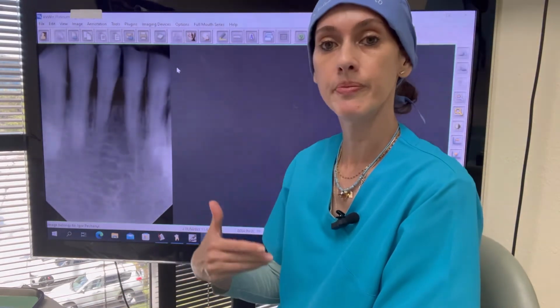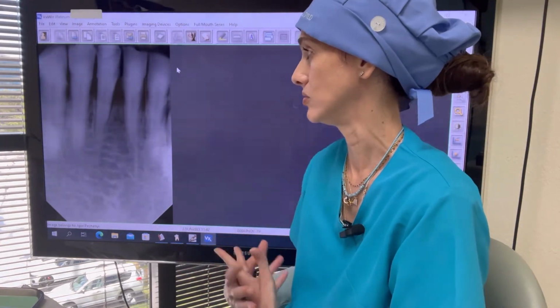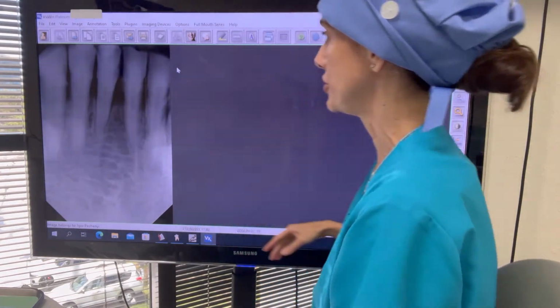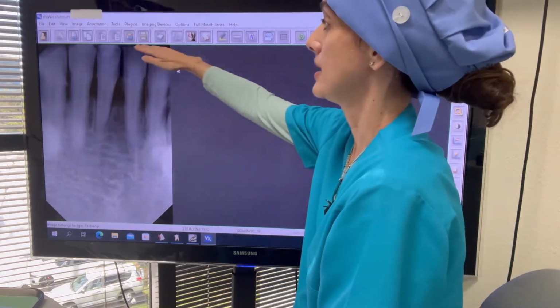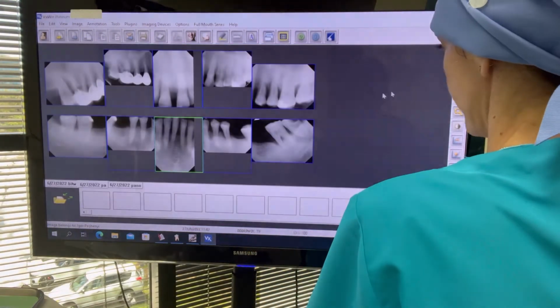Put the patient on a 3-month maintenance regimen of cleanings, good oral hygiene, some home complements, treatments for the patient to do, flossing. Very important to floss because we have to avoid that the tartar solidifies so much that it destroys all the tissues. And also look at the grinding that I was explaining before. So we have to fix that, and we have to put the patient on a night guard as well to prevent any further loss of tooth structure.